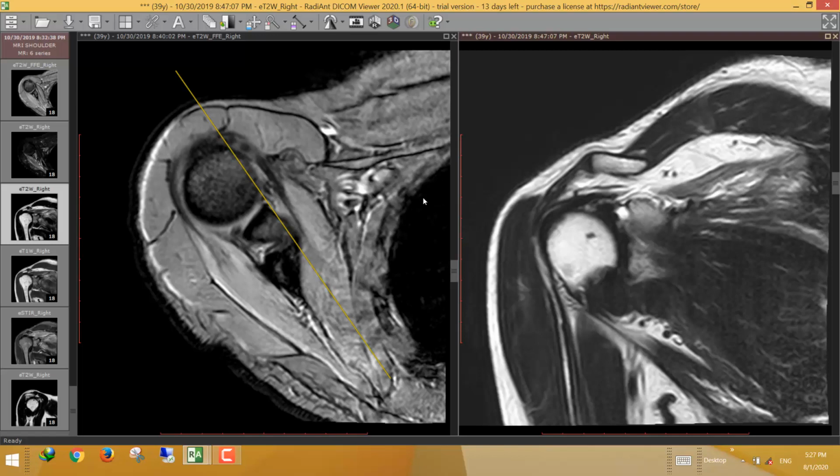In this case, the denervation injury could be related to an injury of one of the roots of the brachial plexus, so we can do an MRI brachial plexus, or it could be due to a viral infection affecting the suprascapular nerve, which is called Parsonage-Turner syndrome, and this is usually a clinical diagnosis, with no evidence of mass lesions.